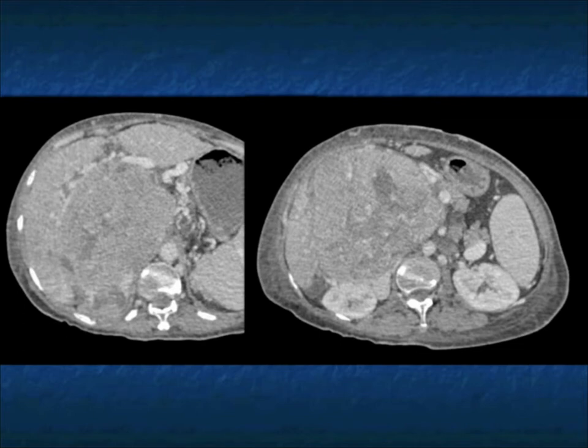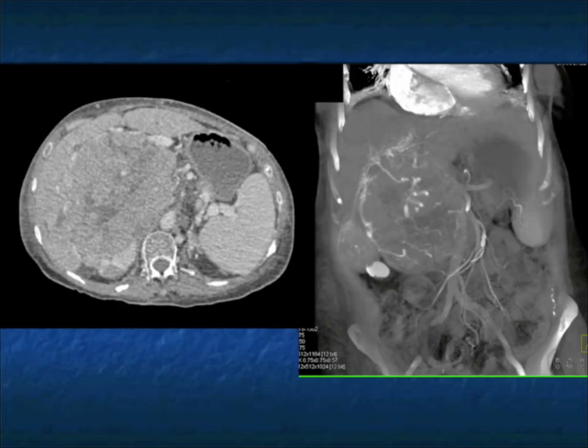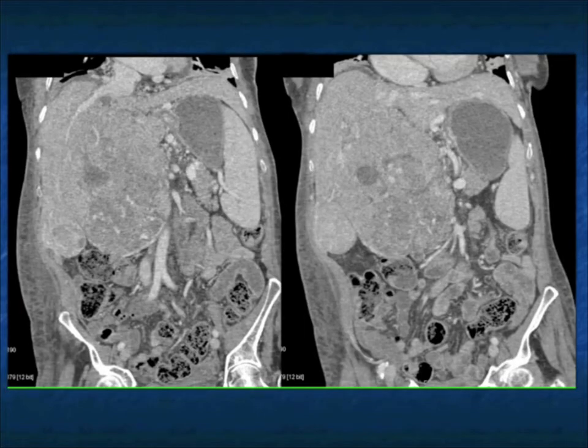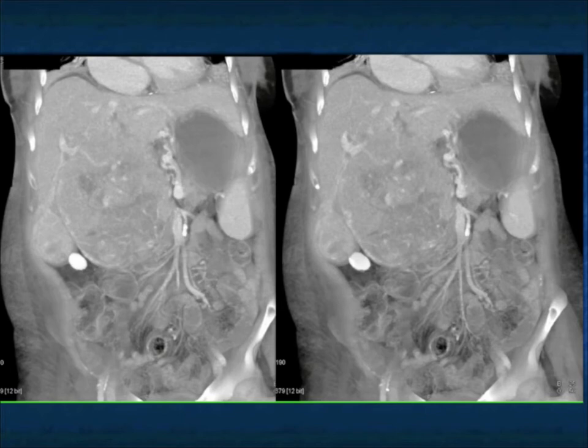Same case, now we're seeing some of the washout of the tumor, we're seeing some of the varices. And you can see as you go even MIP on the venous phase, you can see the peripheral vascularity, the compression, as well as the AV shunting, all very nicely shown. This case, there's little differential diagnosis. You almost could think about angiosarcoma because of the impressive vascularity, but this is good for a hepatoma in a cirrhotic liver. Here again are some later phase images, nicely showing you the mass.